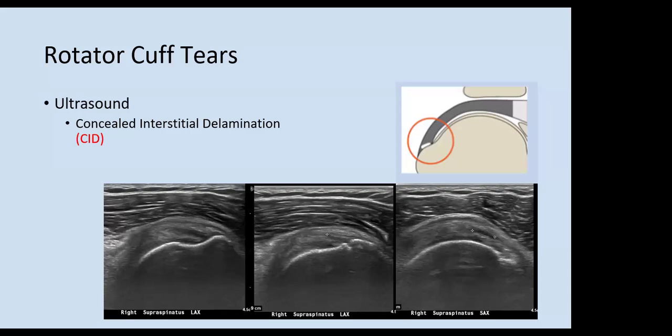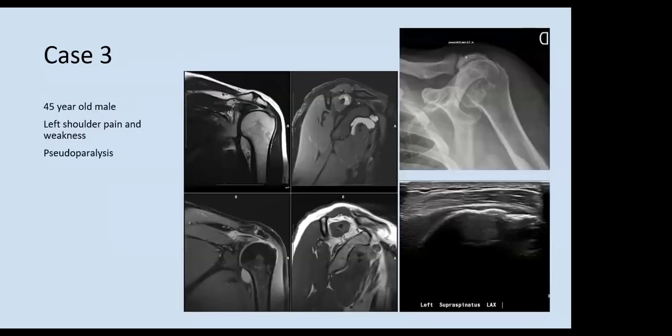That's why MRI scan or ultrasound is really helpful for these patients, because we can detect them on imaging. Okay, we have another case.